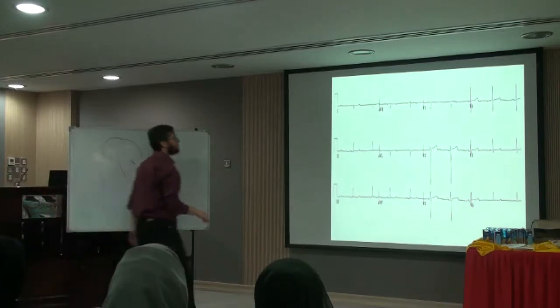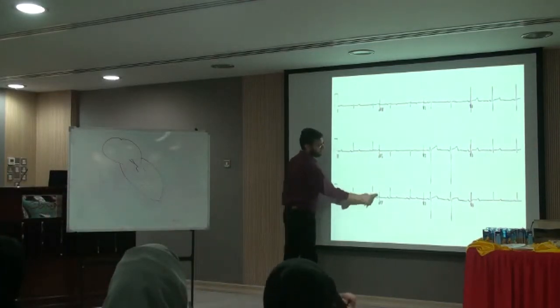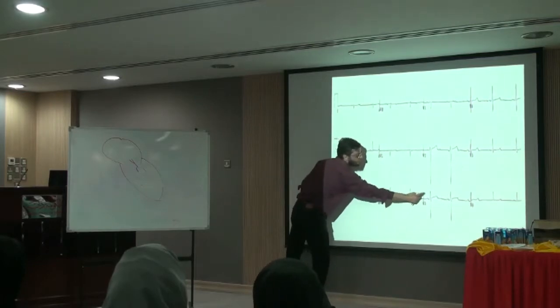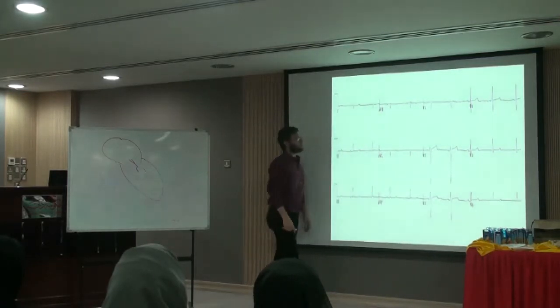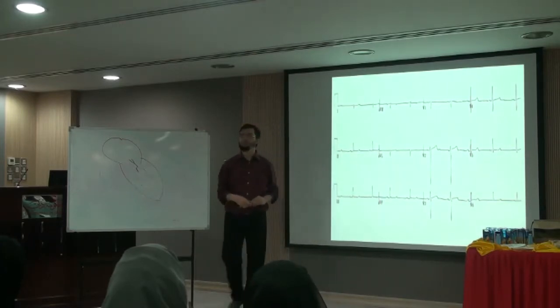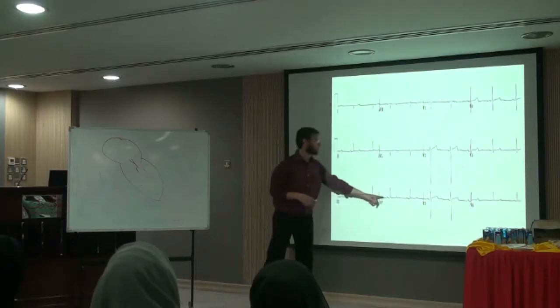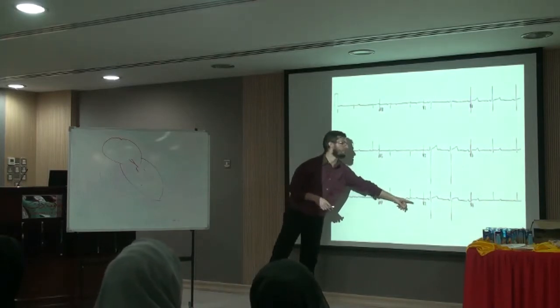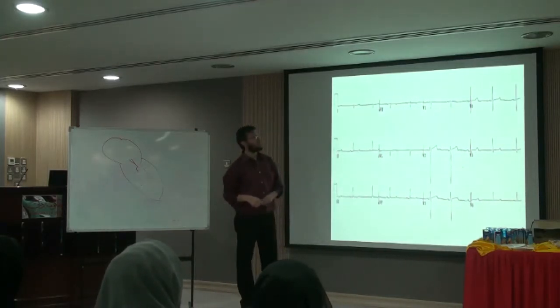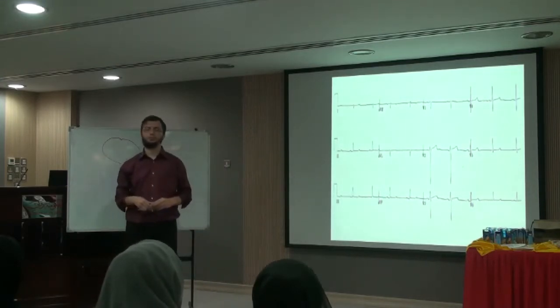Oh, sorry. This is not a complex. This is a marker of the new lead. So this is the beginning of AVF. This is the beginning of V3. So this is not a complex. This is PQRST. PQRST. What about the beginning of the first?